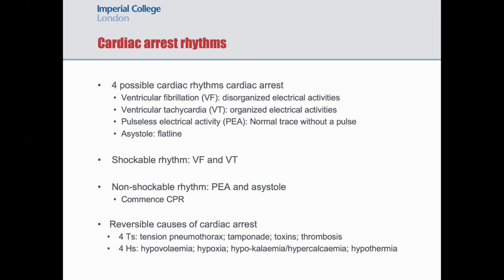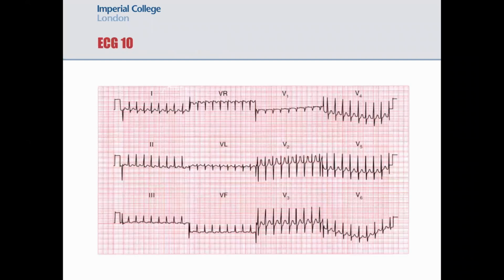Okay, so no one said anything, so I'm gonna move on. So this is our last ECG. Again, try to write down what you think is going on. I think a hint I can give you is that it's regular narrow complex, and see if you think the P wave is present.